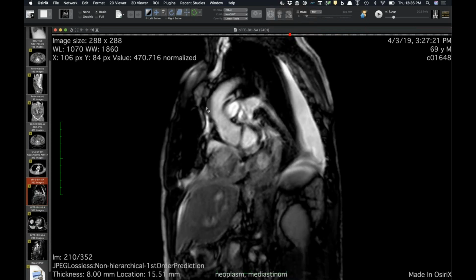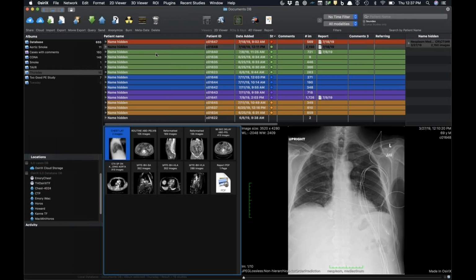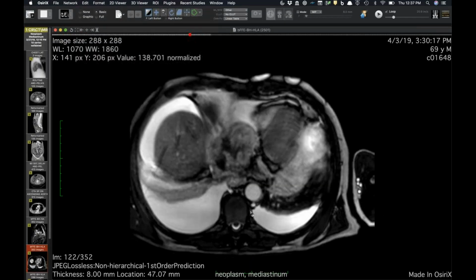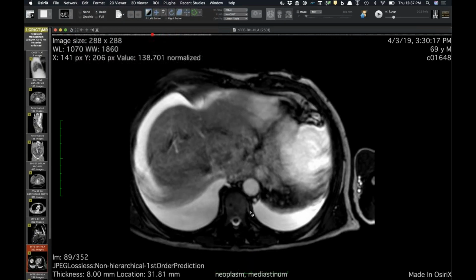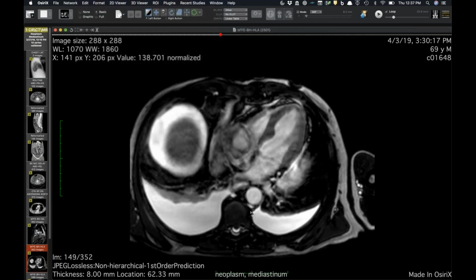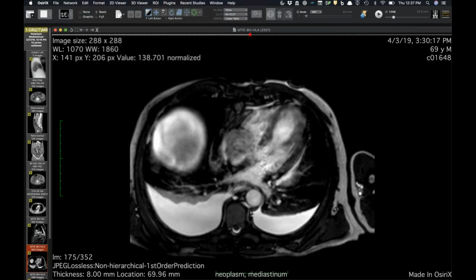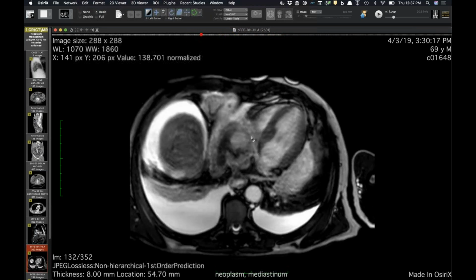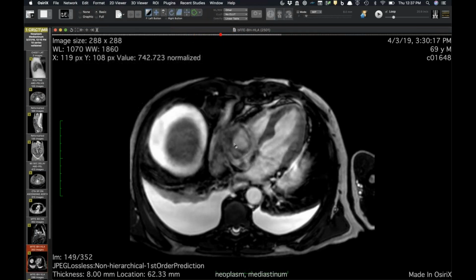So just, sometimes we see sarcomas pop up, and they're often weird and nasty tumors like that, big and ugly. I don't know. What do you guys think that is arising from? Any thoughts? I don't know. I've seen a few cases like this too. You just get a metastasis, but they're so big, they're solitary that it's hard to sort out. Is it lung or pleura? I wonder. Yeah. Yours looks more mediastinal. Yeah. That's why either mediastinum or pericardium, I think. So, yeah.